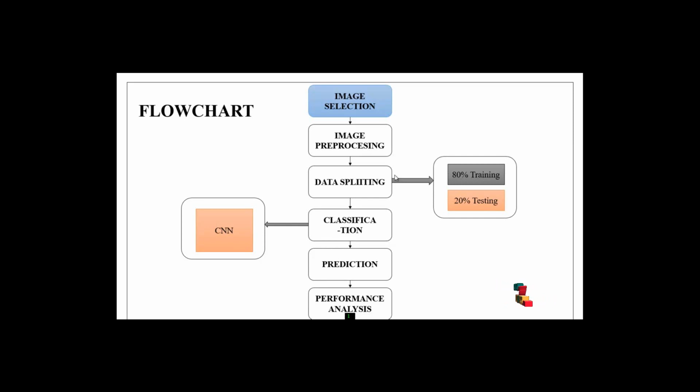For prediction, you select the test image, and we automatically predict whether the bone fracture is detected or not detected. For performance analysis, we are calculating accuracy, precision, recall, F1 score, confusion matrix, everything.